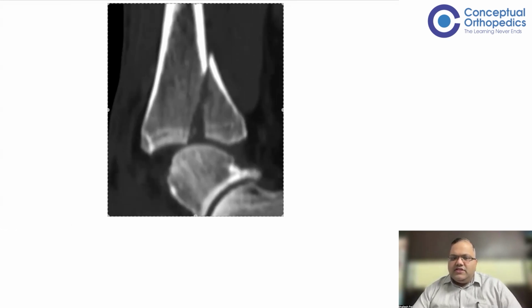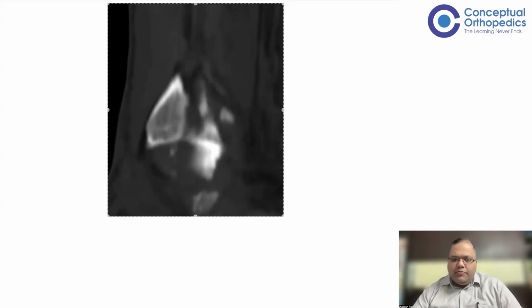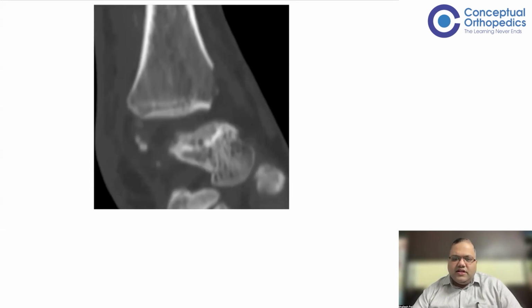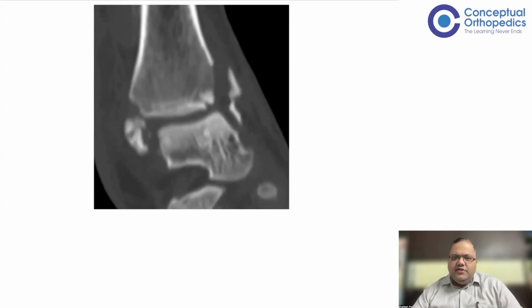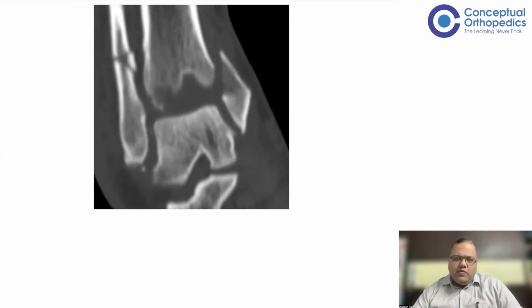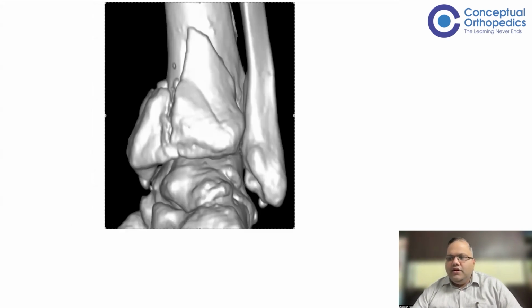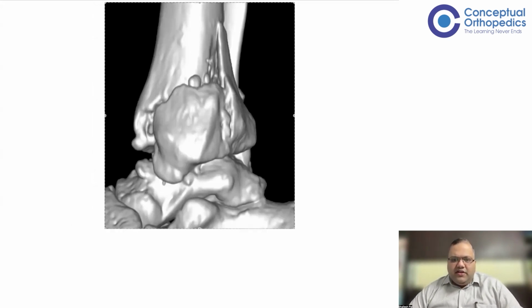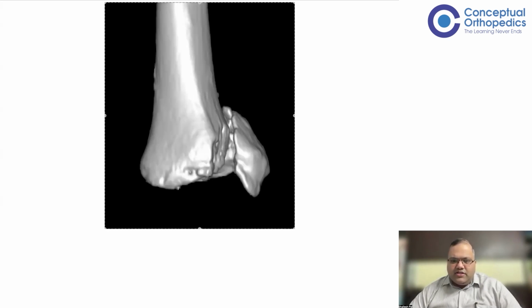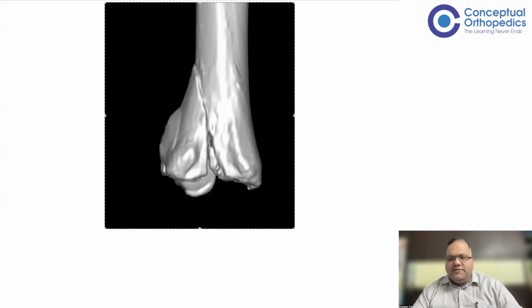All right, so that's the other CT cuts for understanding. We see one big fragment there between the two major fractured bones. And these are the other cuts for understanding. So as we go posterior, we see that there are two quite big impacted fragments which are lying loose. Okay. So this is again the 3D CT, which shows us a nice involvement of the entire posterior part, including the posterior malleolus, posteromedial and posterolateral, going on to the anterior part of the medial malleolus.